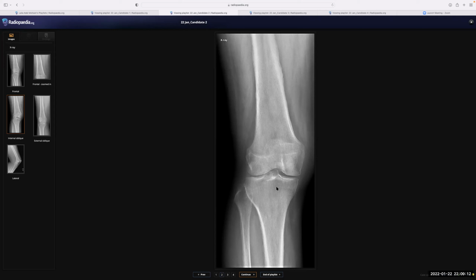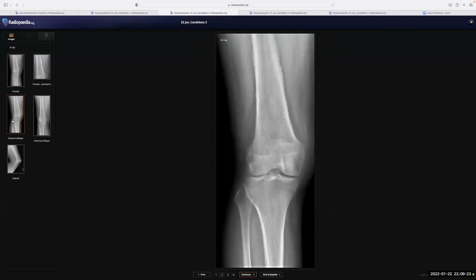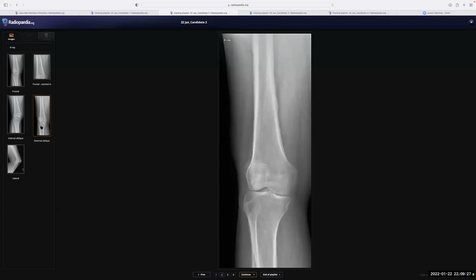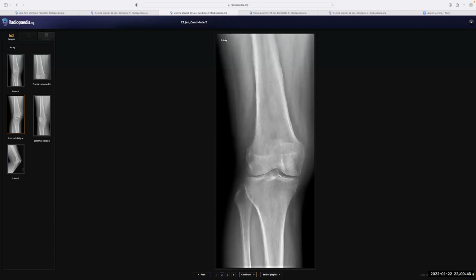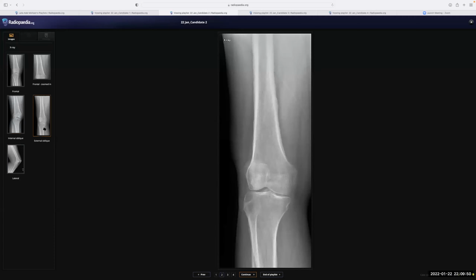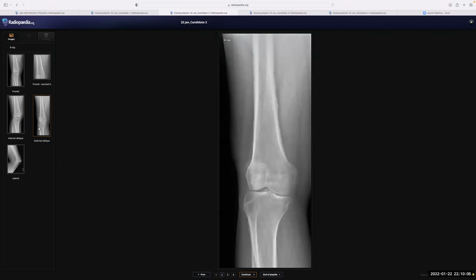Okay, so coming to the upper part, the tibial spines do not look very sharp. I'm not sure if this is projectional or there is sort of avulsion of the tibial spines and the patient has had some sort of traumatic injury. On reflection, I also feel that there's sort of defect in the posterior aspect of the distal femur as well. Not sure if it's related. The fibula also looks okay. So if this is not a true pathology, then I believe the fact that I cannot see the tibial spines very discreetly might be the pathology. And again, an MRI would help in this case.